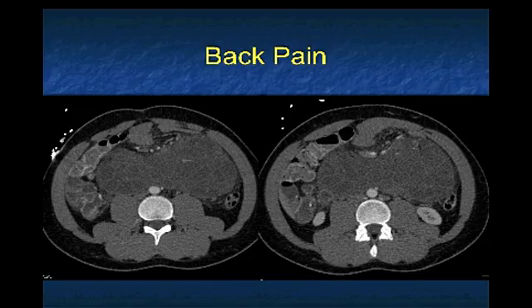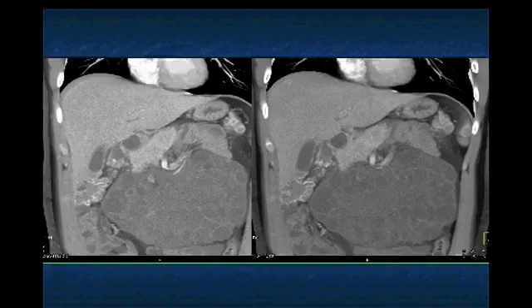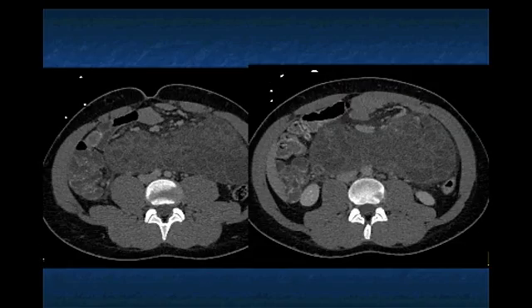Look at this complex cystic lesion tracking from right to left. On arterial phase imaging, its water density has thin septations. You could think about a pancreatic cystic lesion perhaps, but when you look at all the images, it's separate from the pancreas but comes near the head of the pancreas and near bowel. It's really in the mesentery. So what are you dealing with? You're dealing with a mesenteric mass with cystic and septations pushing but not invading the vessel.